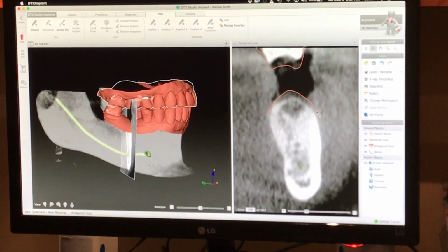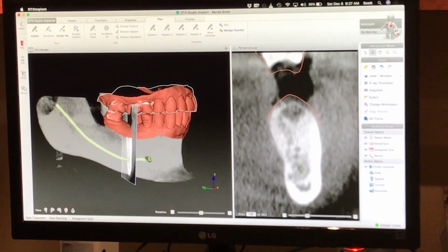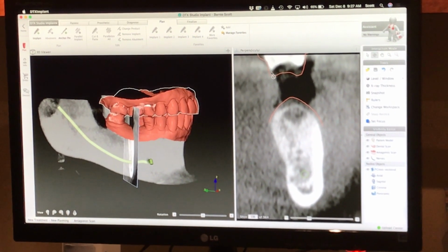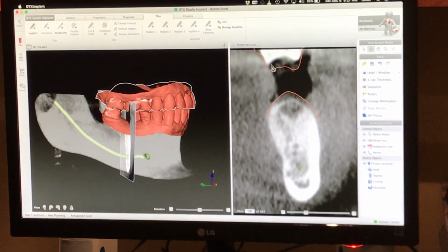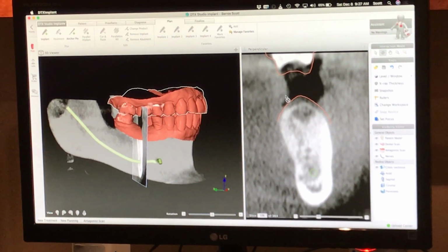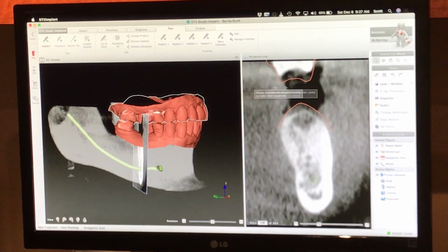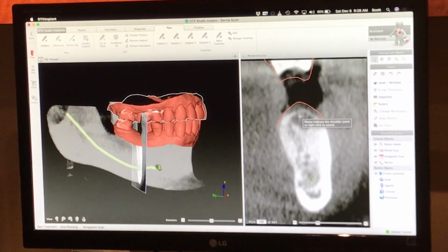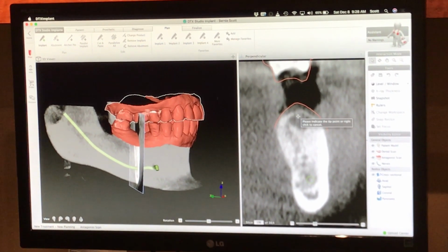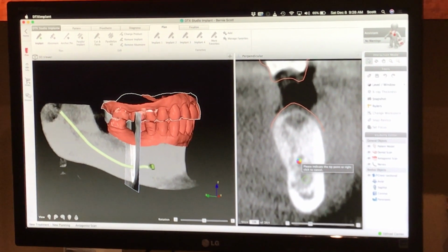So my incision for this case is going to be right in the middle, but most times my incision is going to be in here, but because of his tissue. Now this doesn't line up on the top because the upper model is fitting to the lower model, not the upper scan. Excuse me. So our job now is to plan an implant. So we're going to start by pretending that it's coming in. We're going to put the first mark right here, and then the second mark down here. So our goal is to place an implant here.